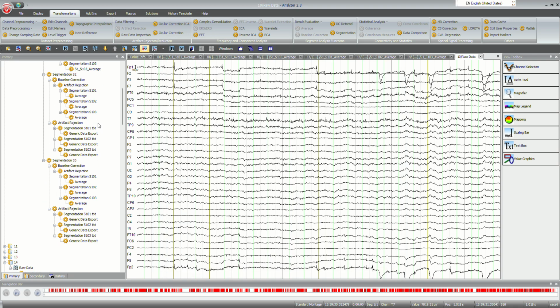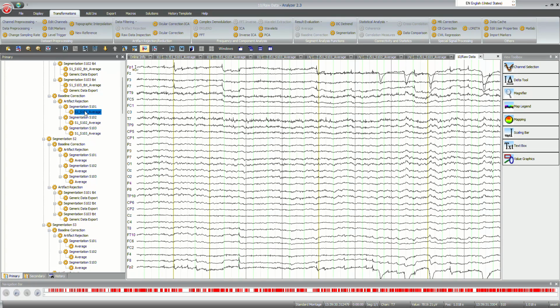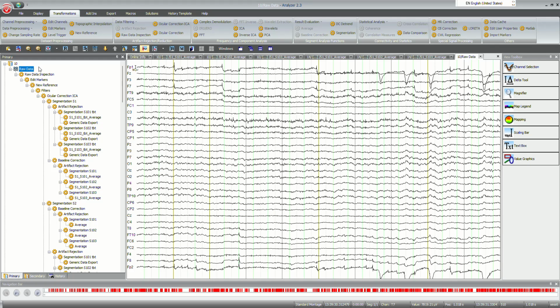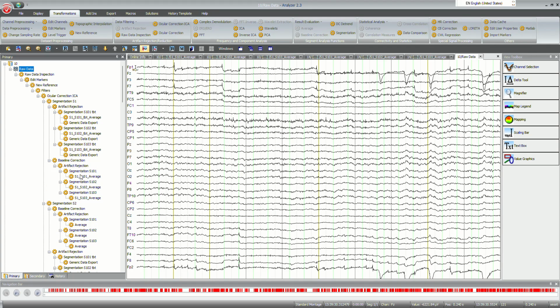These nodes are over here. Yeah, these are the ones we're interested in. We have just selected this one. Usually the way is to select any raw data node here. It doesn't matter which one you select, and then this is just for reference. So the ones we're interested in here are these ones, which are just averages, not grand averages, but just averages.